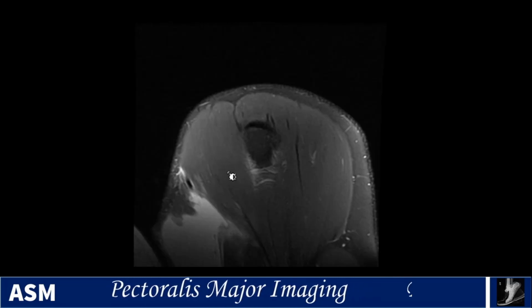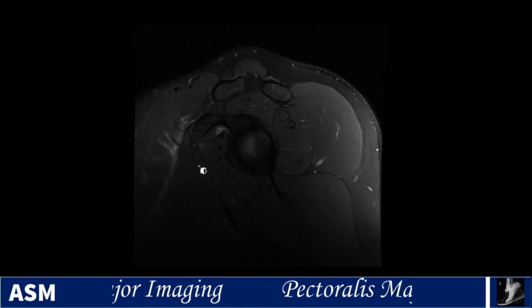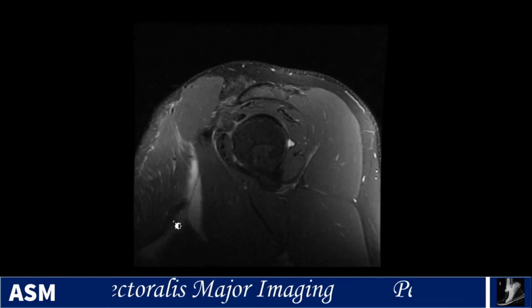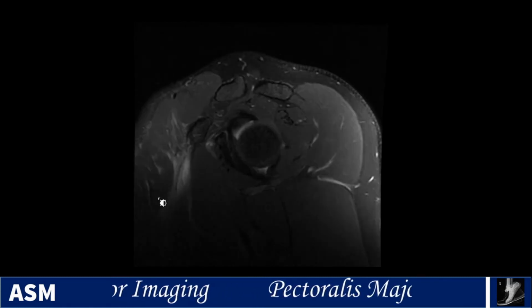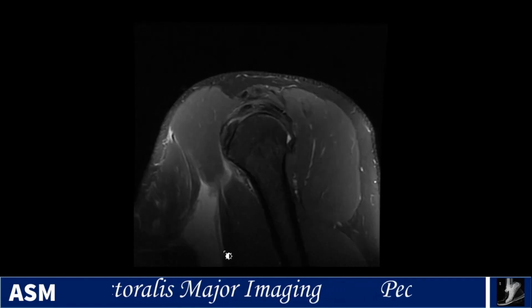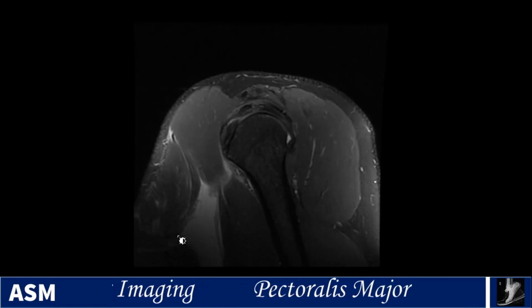So I haven't shown any other views other than the sagittal here, so I want to show the sagittal here because it's good to correlate. And also there's a teaching point here. So you do see that tendon retracted back here, and you can see the muscle back here with the hematoma. So unlike the normal that we saw earlier in the anatomy part, you don't see it ever coming over and reaching to the humerus, and it's redundant and really just stops right abruptly there.